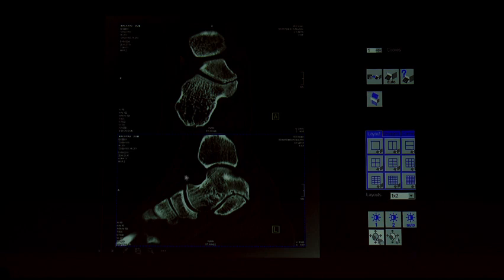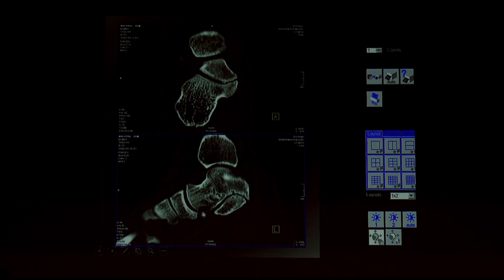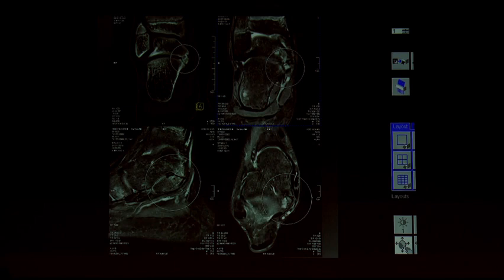And other signs are the talar beak sign. You can see the talar beak sign, and the anteater sign, where you can see the sustentaculum talar will be more of anteater sign, reverse anteater sign, and all these signs we have to carefully look for. And you can see how much the medial facet of the subtalar joint is degenerated whenever there is tarsal coalition. It will produce mass effect over the tibialis posterior and FDL tendons.